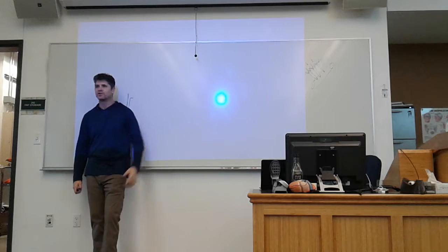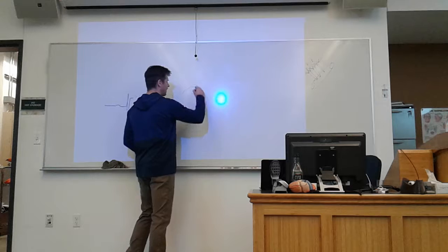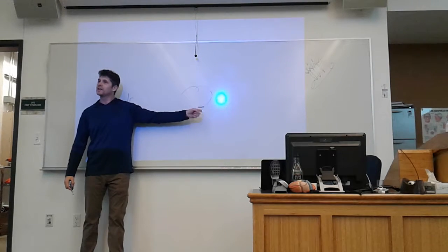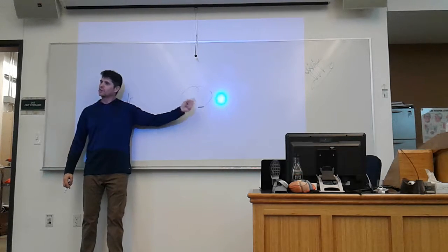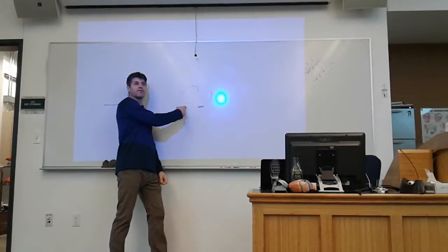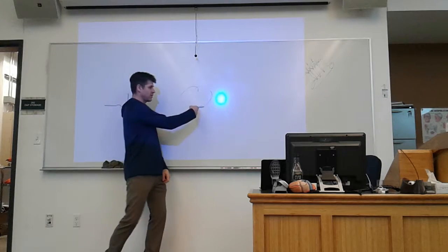They're not part of the average anymore. They are completely out of the electrical mix, which means what happens to my axis? It shifts, because now I have more electrical average over here than I had before.